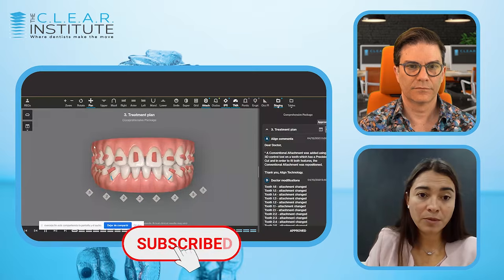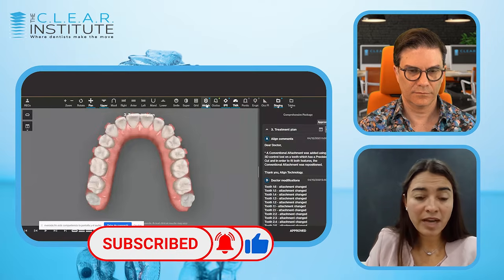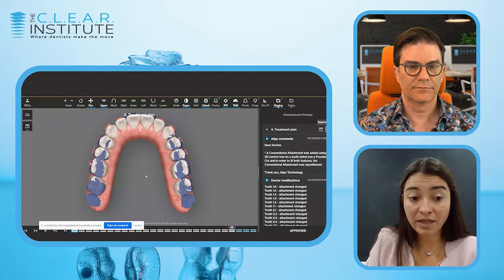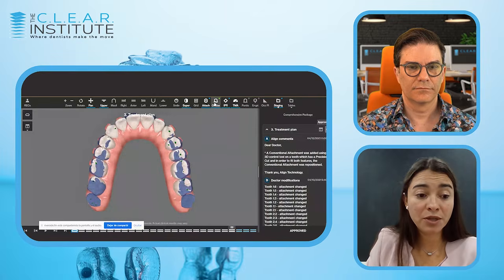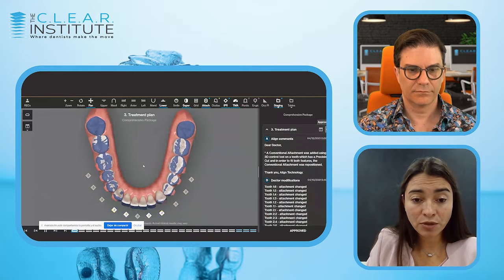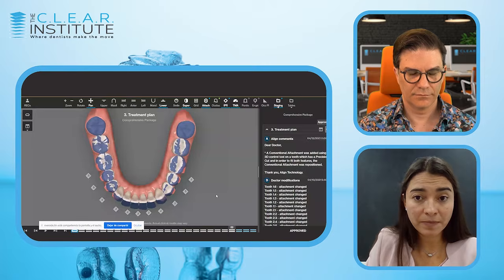First of all, we are still closing the diastema, but we're not moving the third molars, which have very short clinical crowns, and we can't put attachments on them, so they don't need to be moved. In the lower arch, we are applying IPR sufficient to overcorrect the edge-to-edge occlusion.